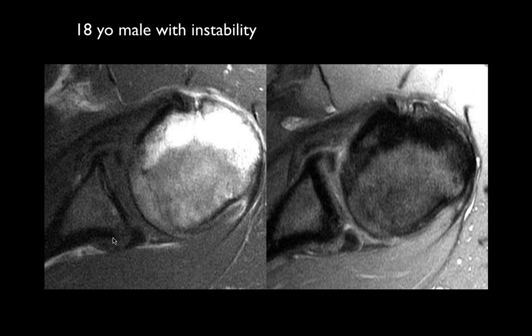Right, but the cortex is that dark line, and then after the cortex and the posterior, right? Okay, but this isn't glenoid here. So this would be some extraarticular process that's growing around the glenoid, some soft tissue. Well, what's this? That must be the posterior labrum. Okay, so what would this be?